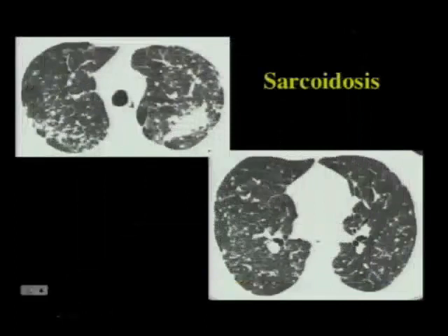Here the CT that accompanies that chest film, and you can see the nodules predominating in the upper lobes. We see nodules at the pleural surfaces peripherally, and this large, irregular mass in the left upper lobe is a conglomeration of nodules occurring in relation to central vessels and bronchi. Again, a typical perilymphatic pattern. These conglomerations of nodules are quite common in patients with bad sarcoid.